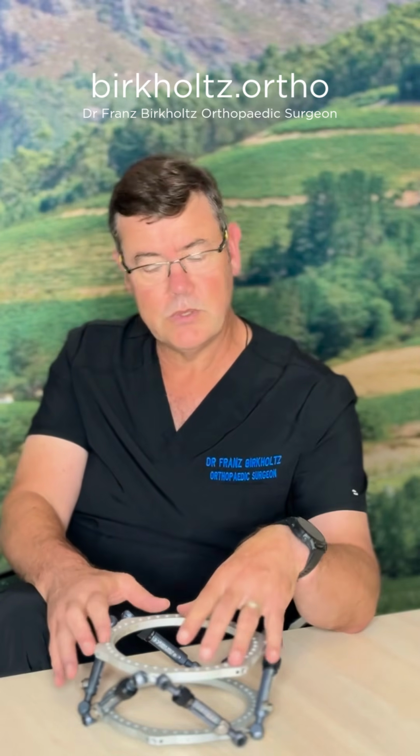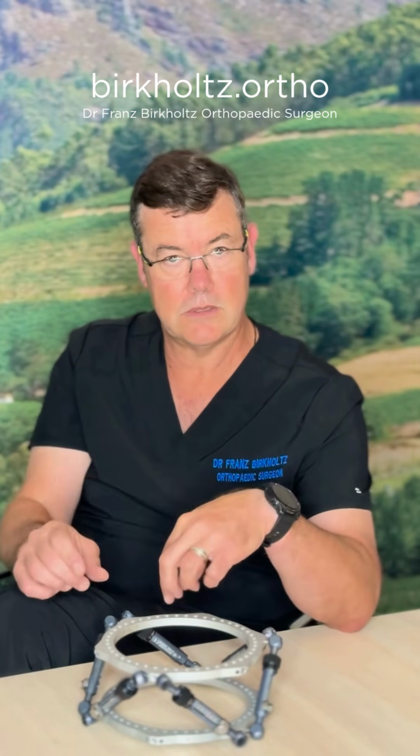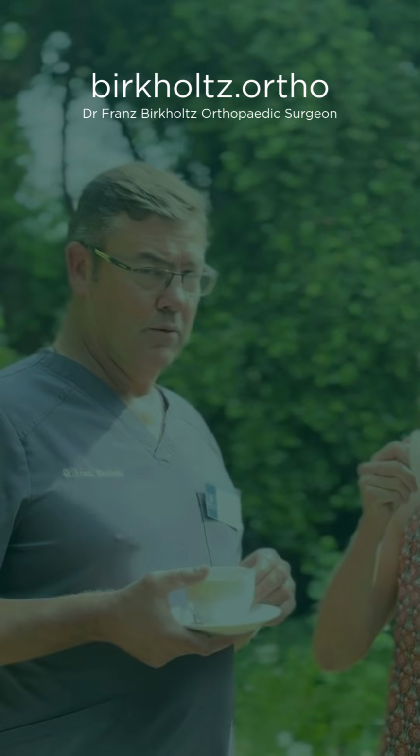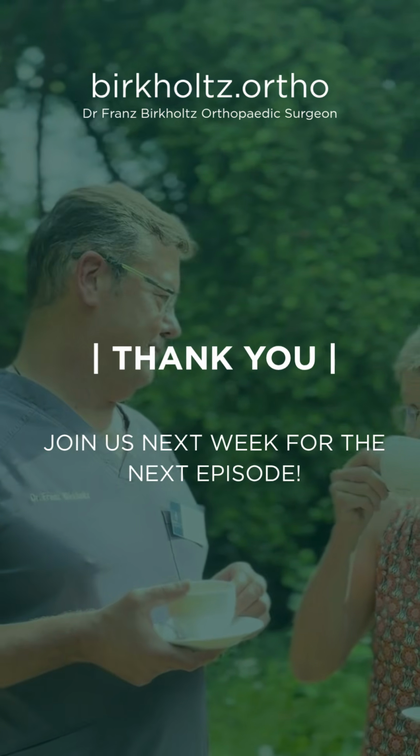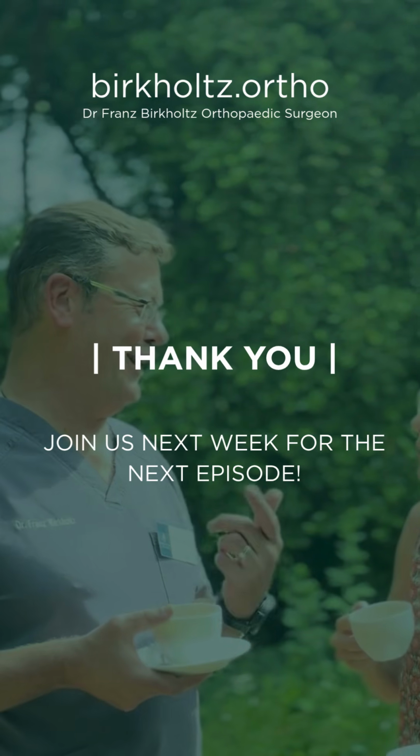So this is a computer hexapod that is driven using specialized software, using the patient's x-rays, the clinical picture, as well as the frame parameters to work out how to adjust each of these struts to get to the end result. It is a device that's close to my heart, and it's saved many limbs, and it's changed many lives for the better.